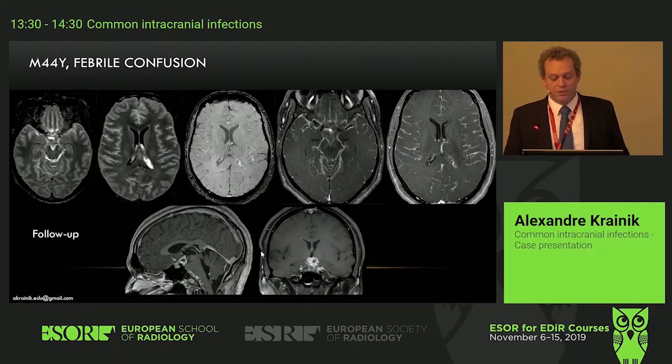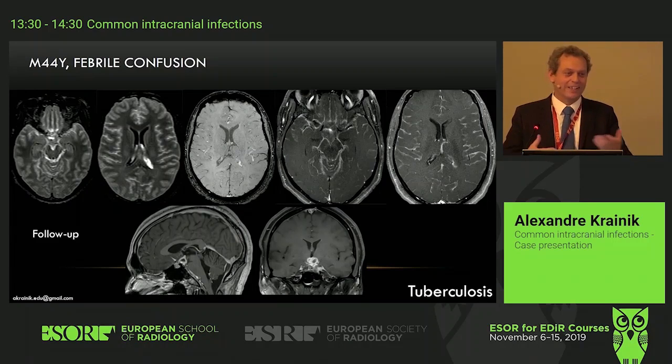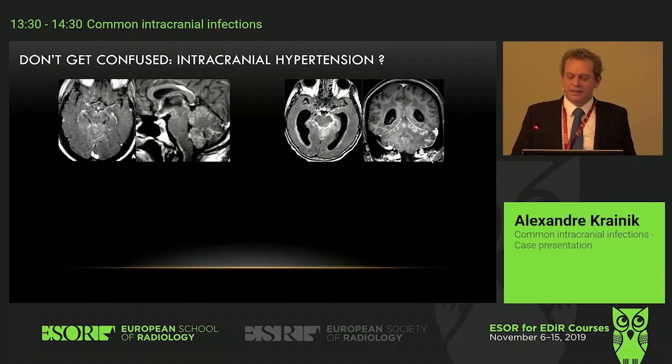On the follow-up, there was even a focal lesion that was developed close to the chiasma, and actually it was a tuberculosis, okay? Then we have the pictures for the workshop, actually for the books, where the tuberculosis looks like it should look, and in practice, tuberculosis may mimic a very common bacterial leptomeningitis. Okay. Then please.